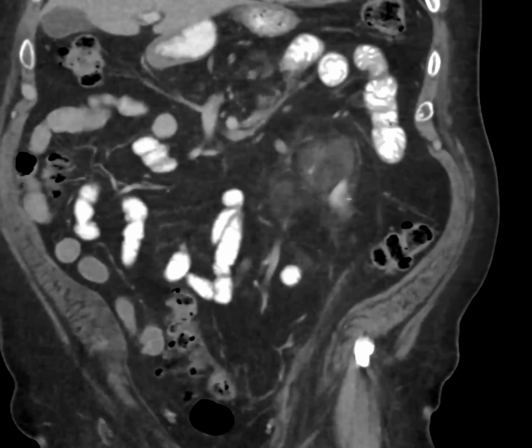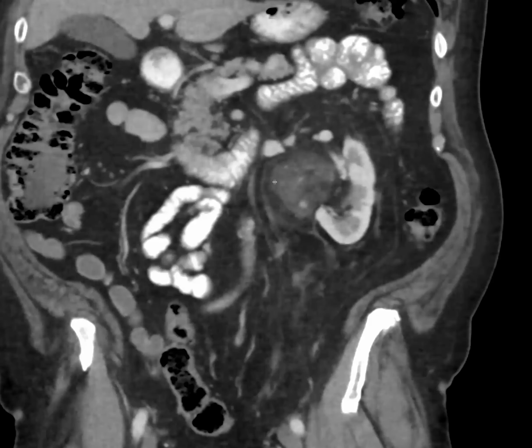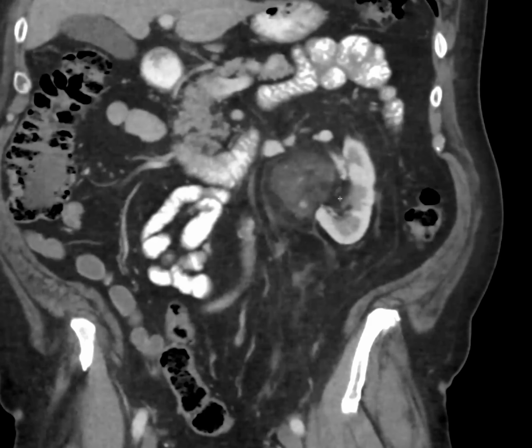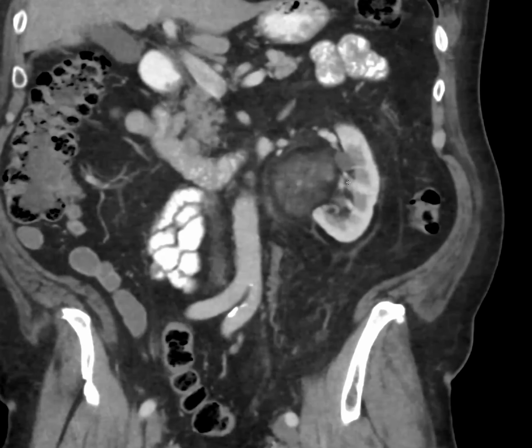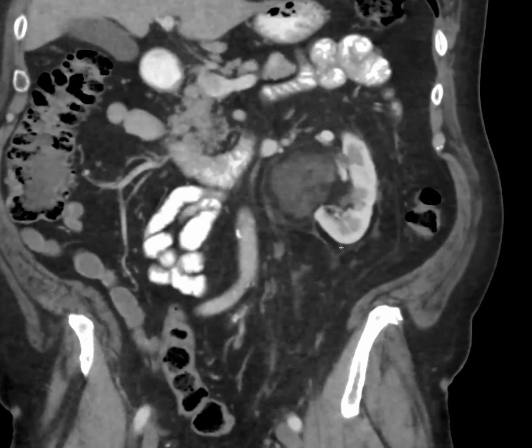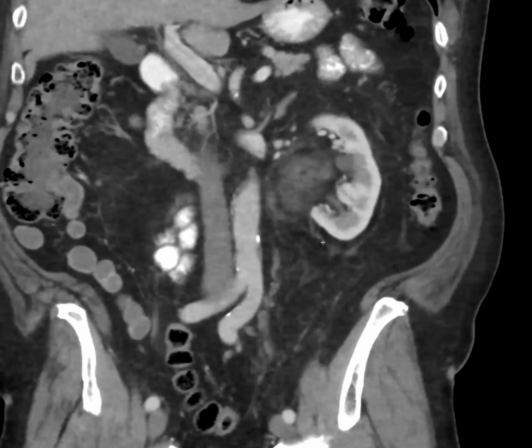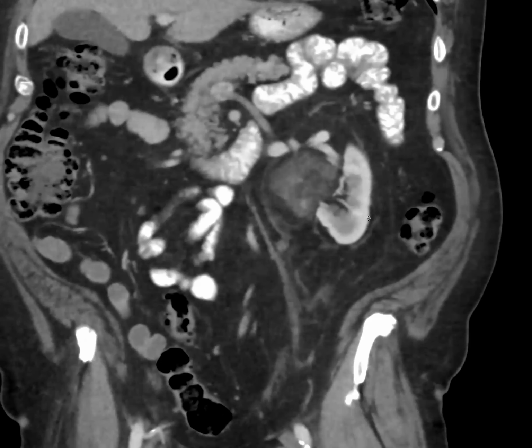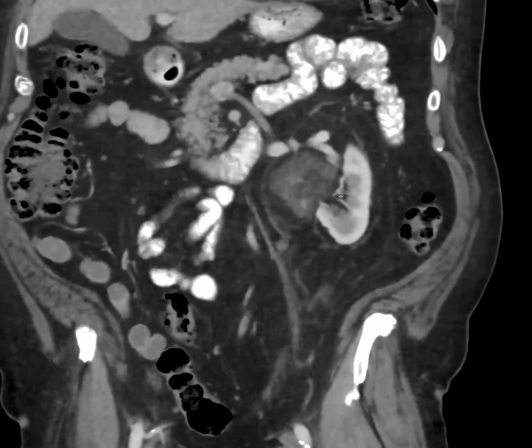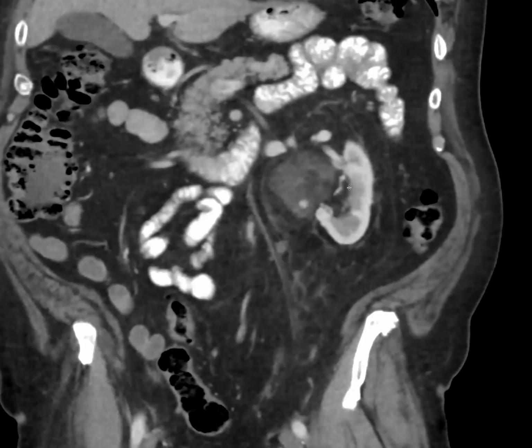It was a very rare case, so I'll just give the diagnosis. They went in for biopsy of this lesion because all these differentials were raised, like AML, like liposarcoma involving the renal hilum. They biopsied and it came back as hibernoma. Oh my gosh, hibernoma. Yeah, so it was very rare. I've never heard of it, so I went and read the literature. It was just hibernoma arising from brown fat reactivation.